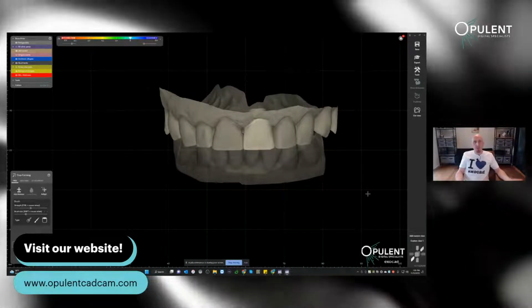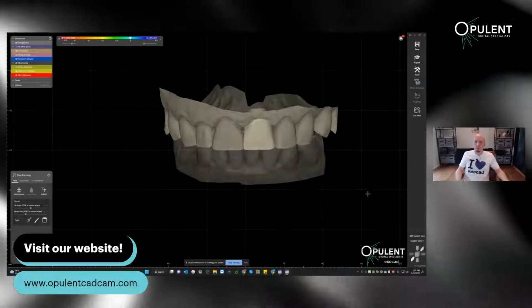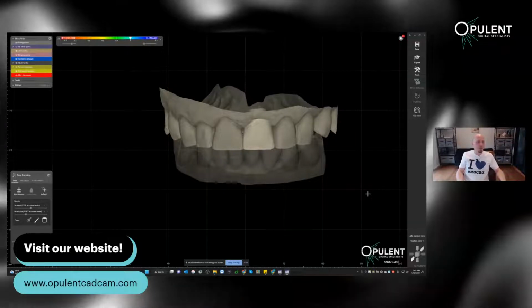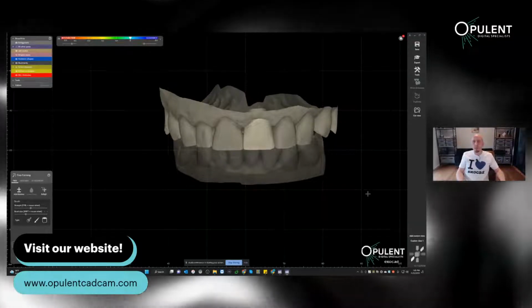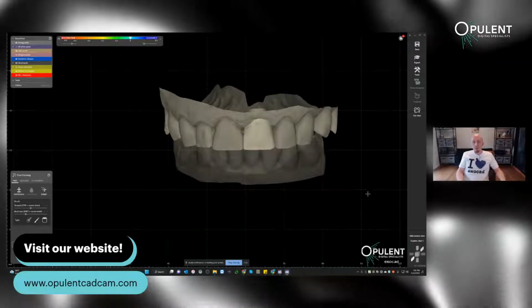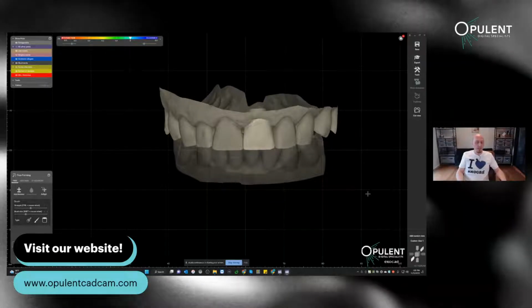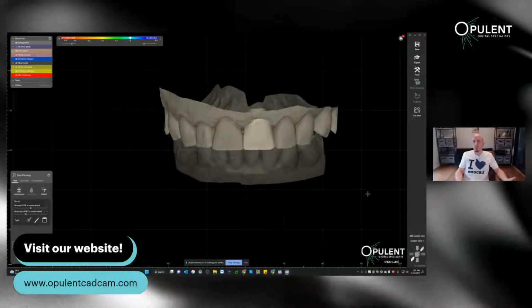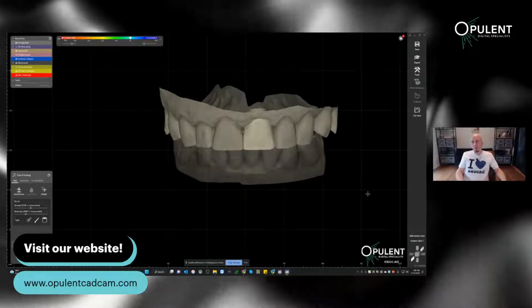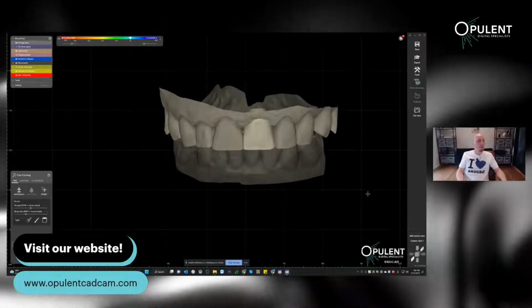We'll also look at the differences between a custom abutment and what's called a Screwmentable, usually around the technicians. So basically a manual screw channel positioning without a scan body, using a stock abutment or something you have customized, and then making a crown on top with a hole in it. It does require the implant module, making a hole through the restoration. Using the attachment tool also requires the implant module, but that's all fair.